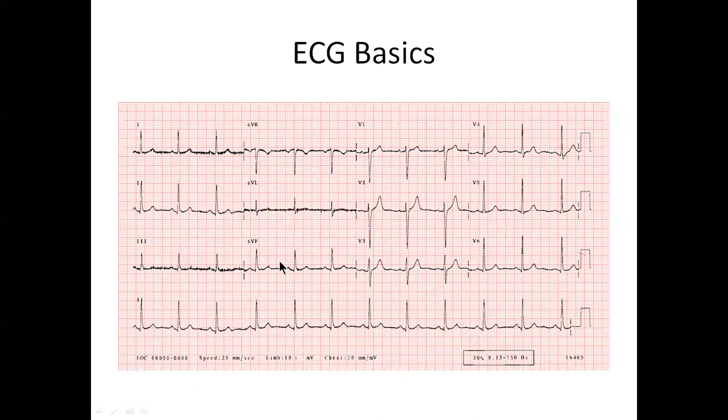So now let's look at these in a real ECG. Remember, the best lead to look at all this is lead 2. This little blip here, that's the P wave. And then this is the PR interval. Then this is the tiny little Q wave, which you can barely see. And then the upward deflection is the R. There is no S on this QRS complex. And then you have the ST segment and then the T.